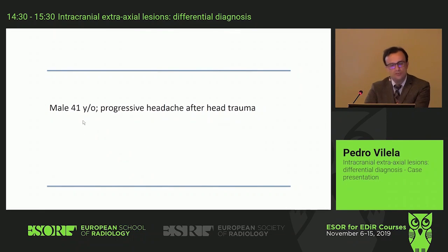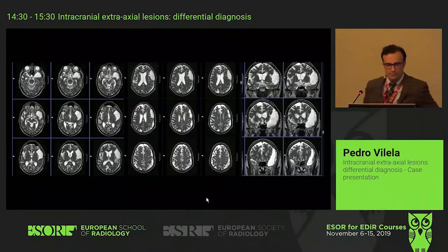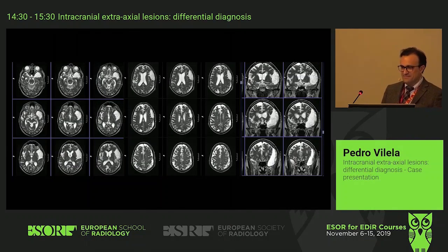Okay, male, 41 years old, progressive headache after head trauma. No clue? Who has the micro? So it's extra axial hyperintensity on the left side, frontal. Extra axial, right? Extra axial.